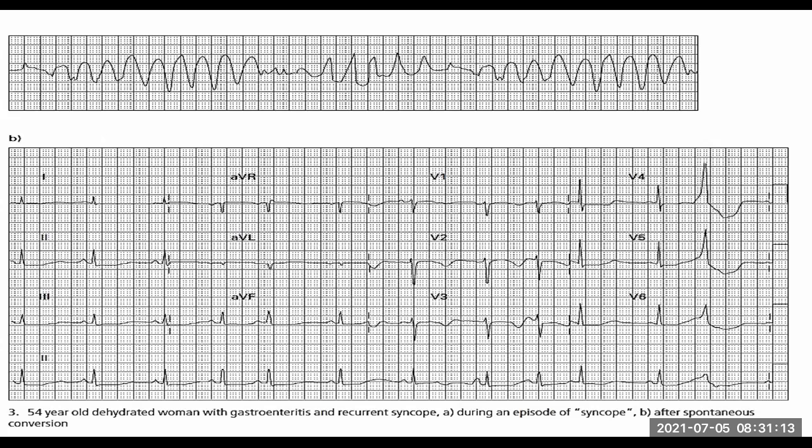Okay. Then you look at your QRS complexes. Are they narrow or are they wide? So what are we saying? Narrow complexes. Right. Does a QRS follow every P? Yes, wherever there's a P wave, there is a QRS complex, all right? And is everything regular? No, it's not regular. You can see there's these occasional, well, let's not call them ectopics, but let's just say premature, all right? Because you get sort of like P wave and then they come, all right? So it's not a regular rhythm, right? Which we can already get from there, but we'll get back to it now.